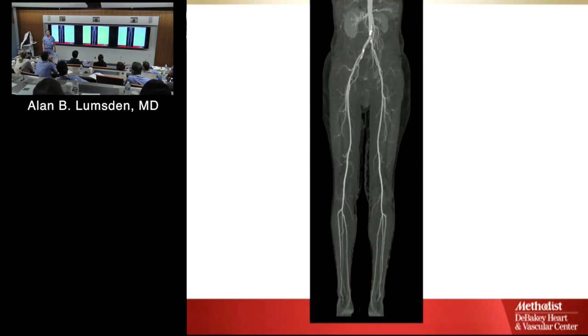Yeah. So you're always taking the history and thinking about what the vascular anatomy is when I'm seeing you in the office. It's very gratifying when you get the CT scan and the whole thing actually fits together. Doesn't always happen, unfortunately. Okay, so internal iliacs, what's that? Profunda, right profunda. These are the perforating branches coming off the profunda. We take that out, branches are going to come down through the muscle and recollateralize down to here.